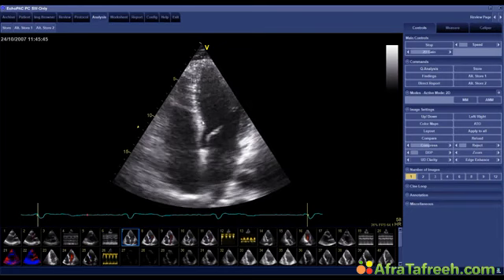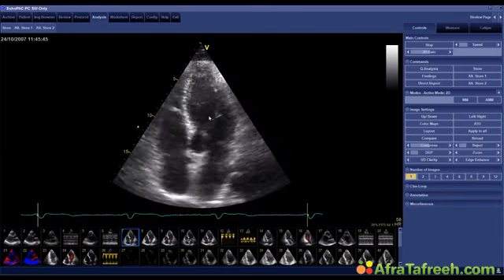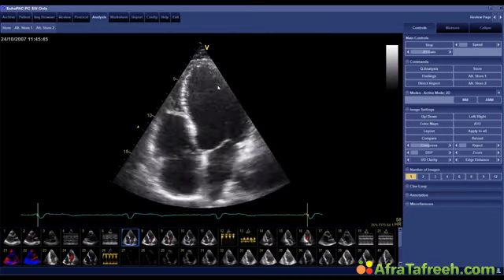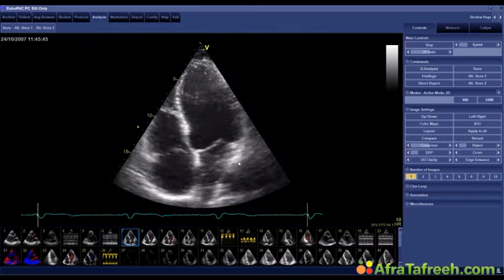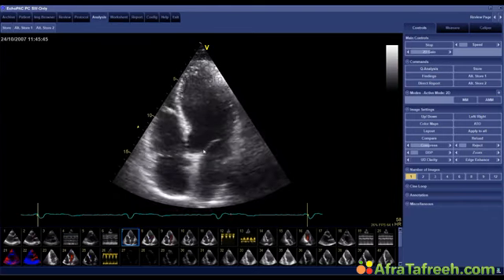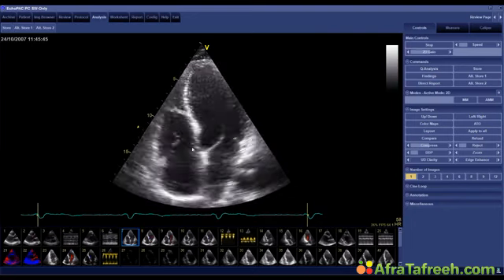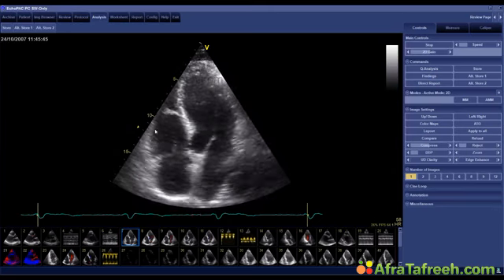You have an inward motion of the septum, then an inward motion of the lateral wall, and then again an inward motion of the septum. So the problem we have to start out with is to define when is systole and when is diastole. This will also make it difficult not only to calculate the ejection fraction with the help of the fractional shortening in the M mode, but also with 2D imaging. So in other words, with a left bundle branch block, we will always underestimate left ventricular function.